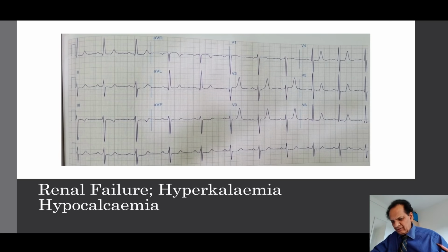In renal failure, I am showing you because of the hyperkalemia also and hypocalcemia also. This is an important picture here. Hypocalcemia, prolonged ST segment and such a T. In a renal failure patient, this is a good one.